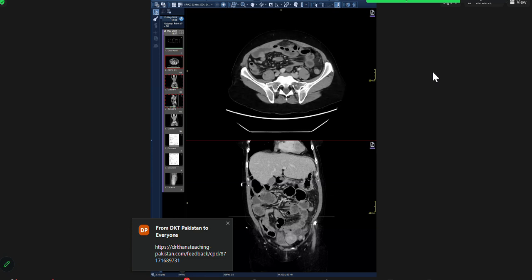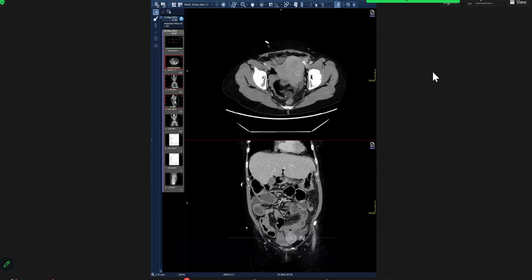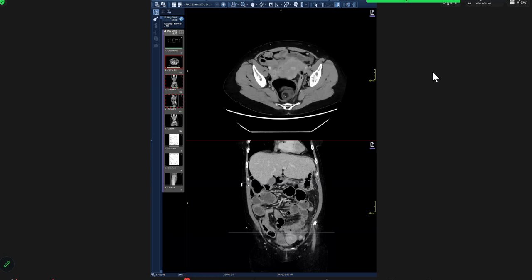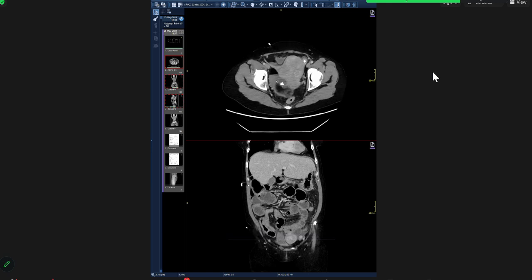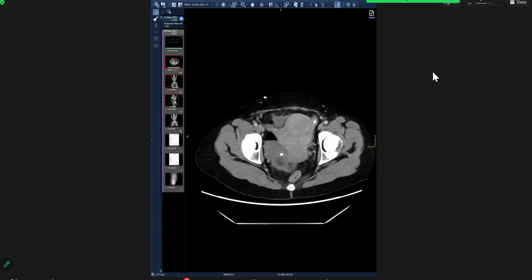This is a female patient. I kept showing you this, but you didn't even come towards this. This is calcification. This is fat. So this was a dermoid. But what is this here? The ruptured dermoid. It is a ruptured dermoid.